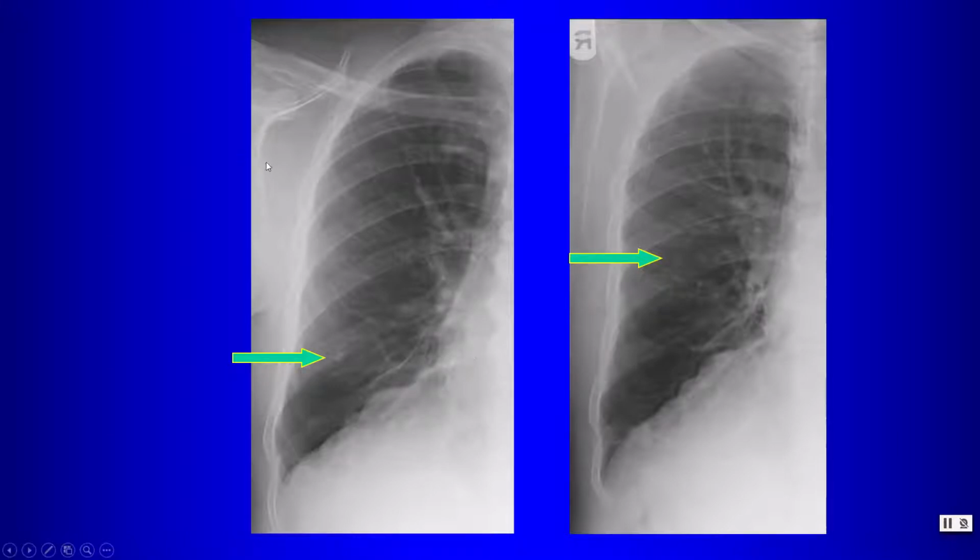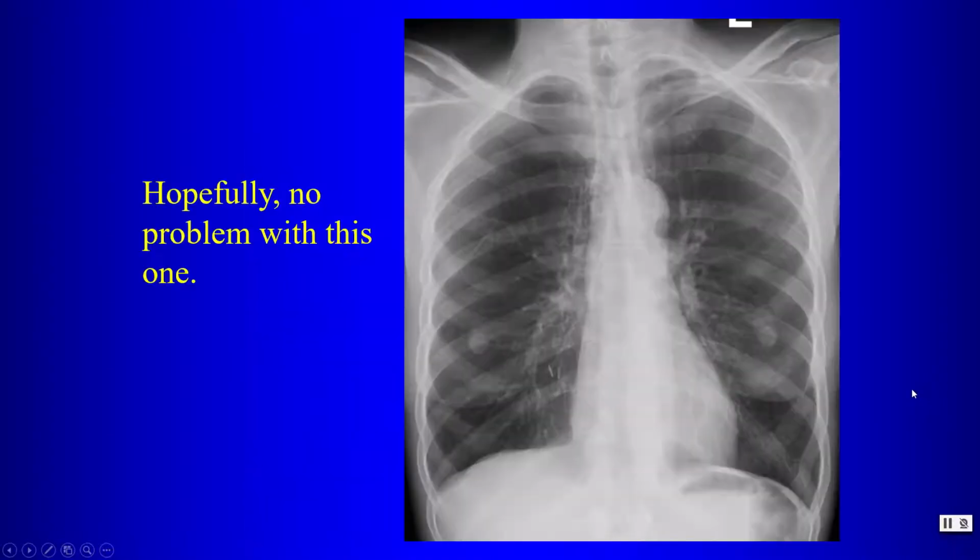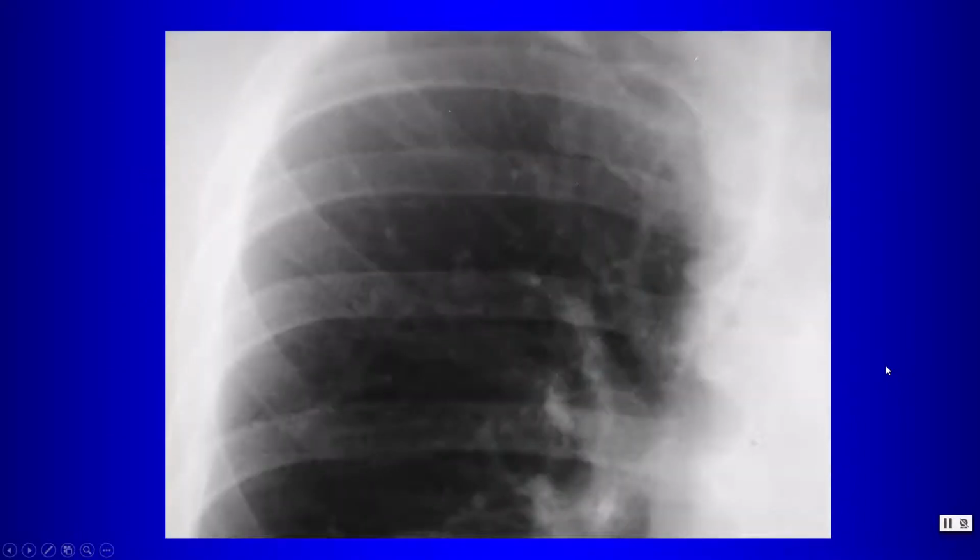Notice, however, the position of the scapula. In the subsequent radiograph, the patient's arms are raised, as this was a PA chest radiograph, so this also represents a nipple shadow. Raising of the arms will also raise the nipple shadow and change its position relative to the background structures within the thorax. Now hopefully, if you have a case like this where you have two completely symmetric nodular opacities, we have no problem in saying that these represent nipple shadows.